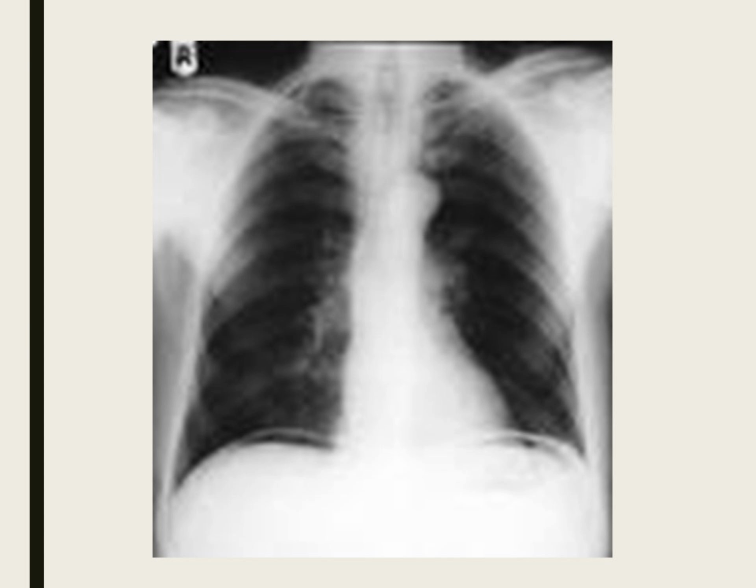Focus on the diaphragms. There are two lines to them. Huh? There are 2 lines instead of 1. Okay, why? Air. Yeah, so it's air between them. So the diaphragm is the diaphragm, right? So this is your diaphragm, really. The stuff below it is what goes below the diaphragm. The liver, right? So this is other things.